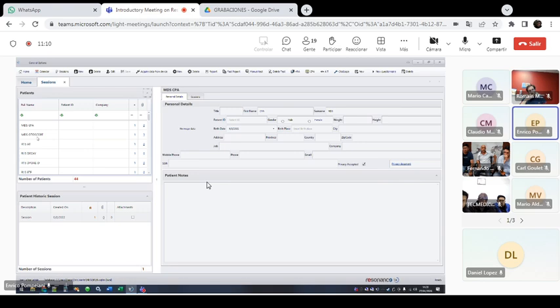You have to create the patient in the MDS if you are using an R37A instead.